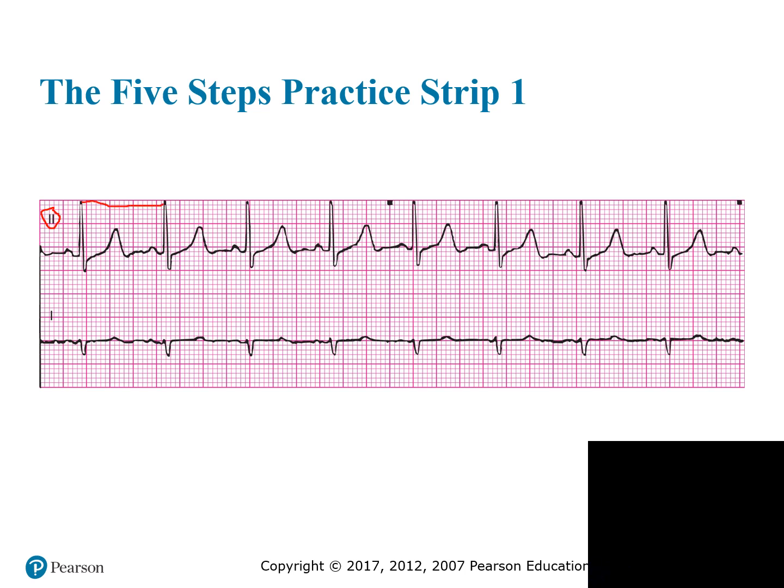So we're going to go from R to R and figure out how many little blocks we have in between each R to R. I told you I couldn't draw straight. I think this is safer for me to do it this way.